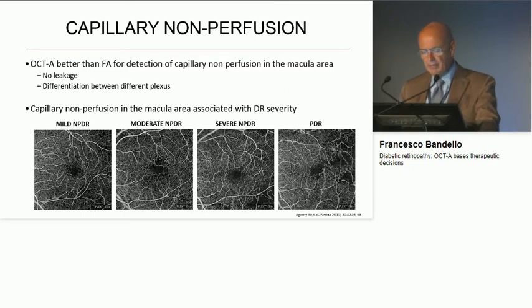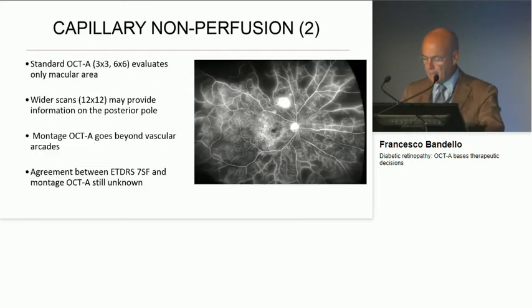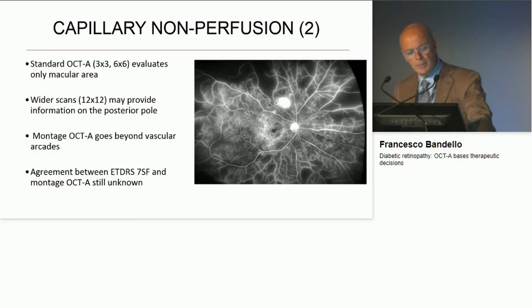You have this kind of capillary non-perfusion information which is not complicated by leakage. You have the vessels in any phase, so you do not need to evaluate them only in the very early phase of the angiogram, as we did when fluorescein angiography was the basis for this kind of evaluation.